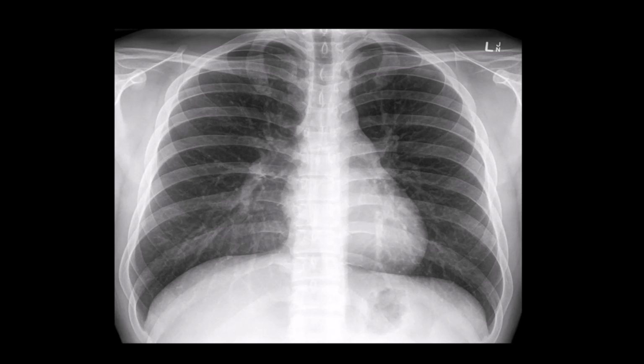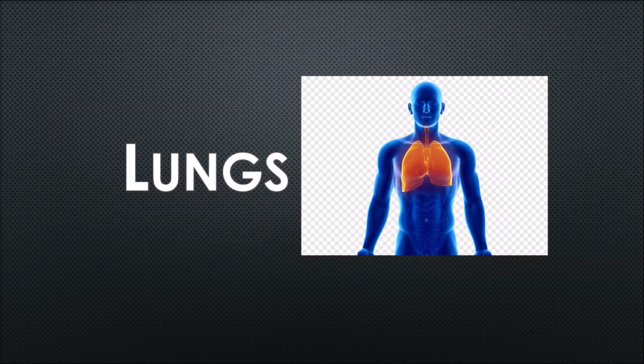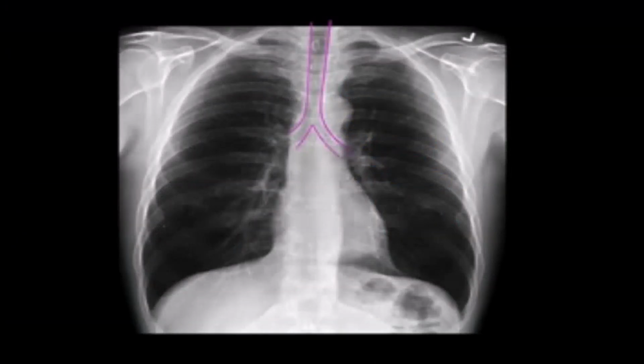Let's get into more detail about the airway and lungs in a chest X-ray one by one. Here is the trachea, this borderline marks it. The trachea is the tube that carries air from the throat to the lungs. Normally the trachea runs right down the middle of your throat behind your larynx. Any deviation in the trachea gives us a clue about an abnormality.